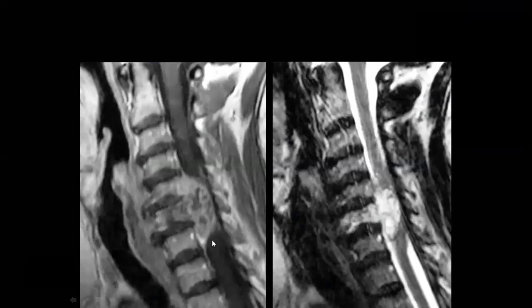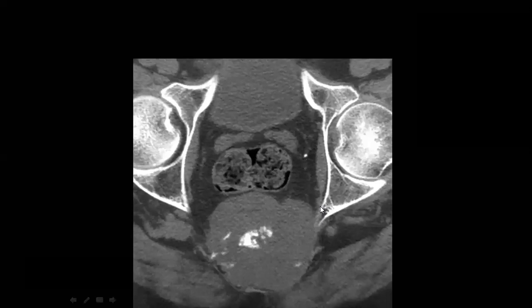It can come to you like this. This is a good differential for the enhancing component. Yeah, it can be infection, I agree. What else? Tumor, yeah, like lymphoma. It can be metastasis, yeah. Yes, okay, hematoma, but enhancement in hematoma is very weak.